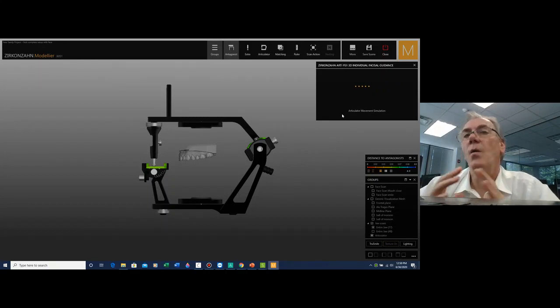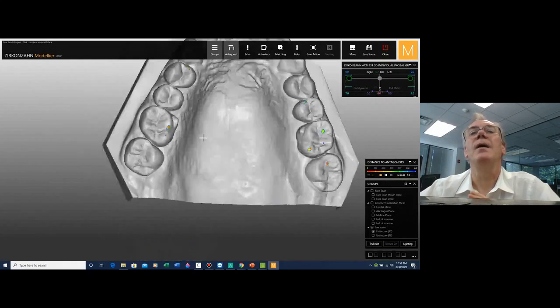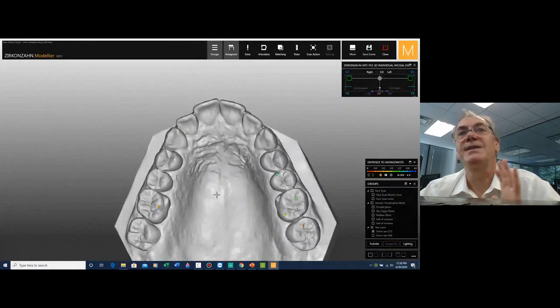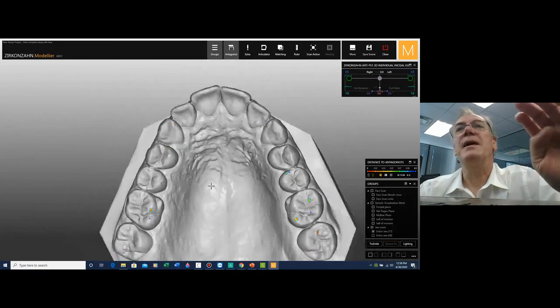So we are putting together all these elements to get a better understanding of what direction we should actually be moving. And what happens if we do perform something? As you see, you might touch one pre-contact on a tooth, and 10 more will pop up on another side. So sometimes it's really worthwhile taking a look at everything, and sometimes it's just better walking away. But with patience, we can really get a good understanding of how everything works.